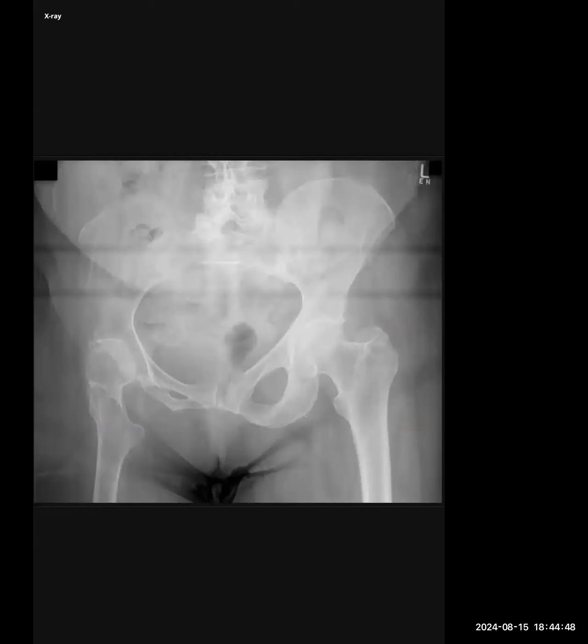Here you go. So I'm presented with the frontal radiograph of the pelvis of a skeletally mature patient. The striking finding is the hypoplasia of the right side of the hemipelvis with demineralization on this side. Also, I can see that the right proximal femur is also attenuated and hypodense. And actually the whole hemipelvis, including the pubic bone and the ischial bone, appears hypoplastic.